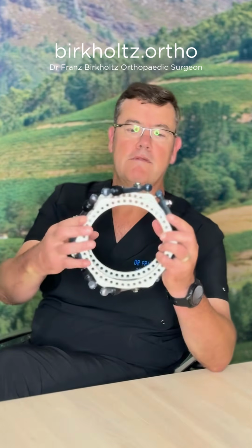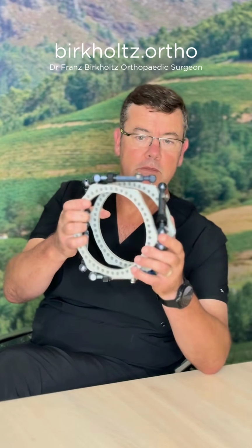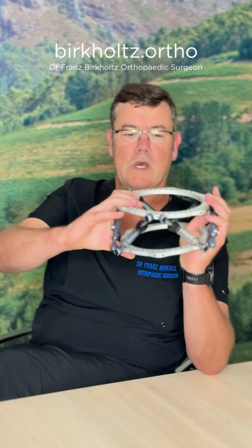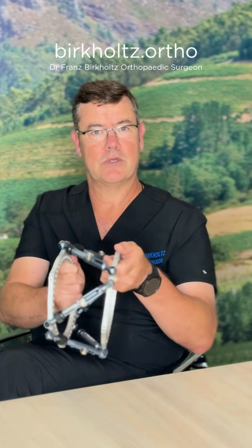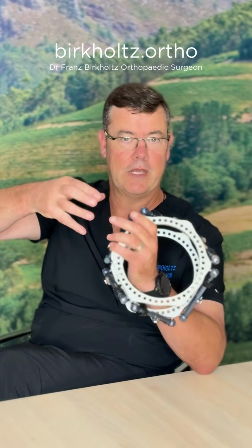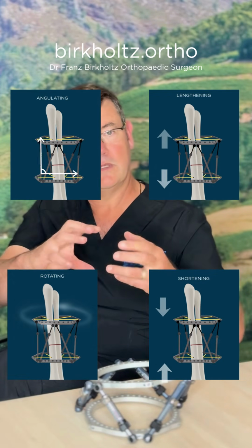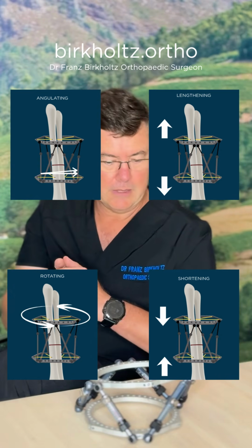Another feature of having the limb suspended within the scaffold, within the frame, is the ability to manipulate those bone segments or bone fragments. You can imagine that if you have 2 bone fragments, one attached to each of the rings, by moving these rings around in 3-dimensional space, you can actually change the orientation between those fragments. And you can do that in all dimensions at the same time. So you could have the limb lengthen, shorten, angulate, rotate, or all of these at the same time.